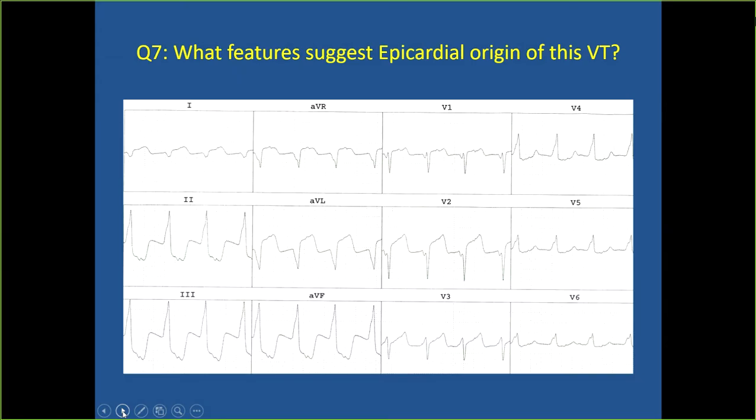So, okay. What features suggest epicardial origin of this VT? Okay, this is a teaching point. I have already said this is epicardial origin. So there is no doubt that this is a VT. I have already said because I know the case also. Now tell me, what are the features?